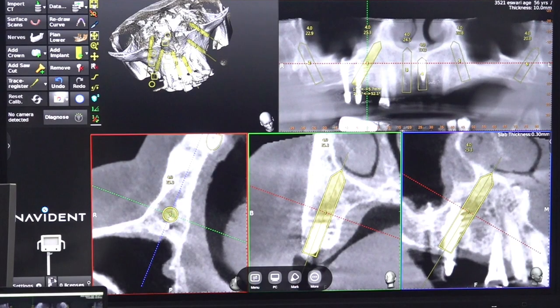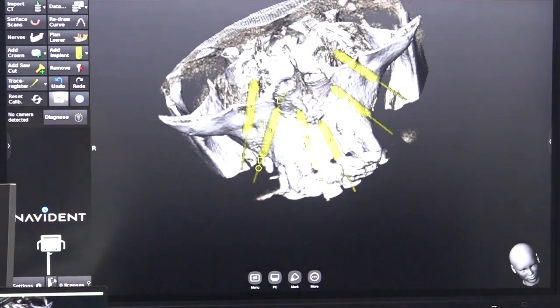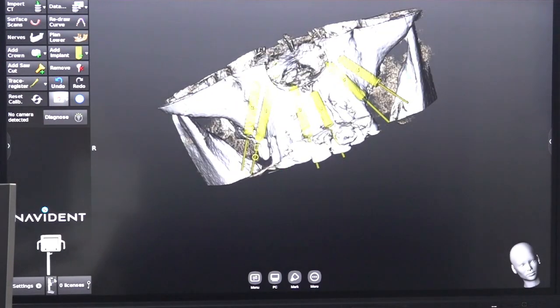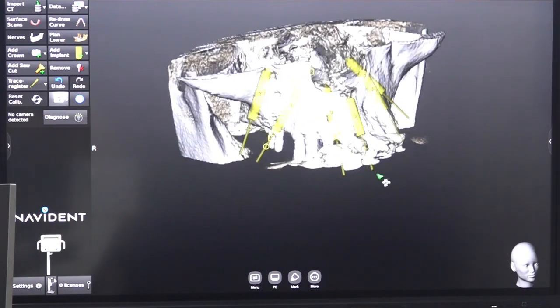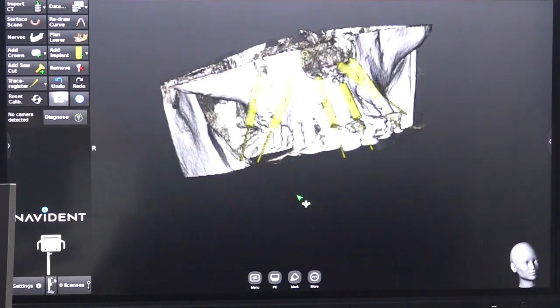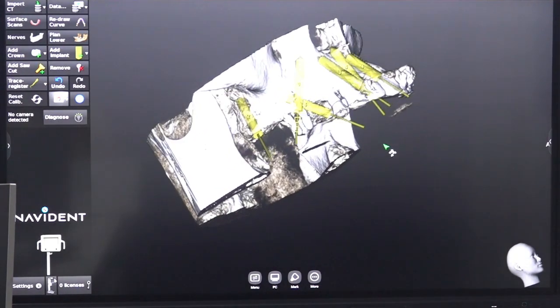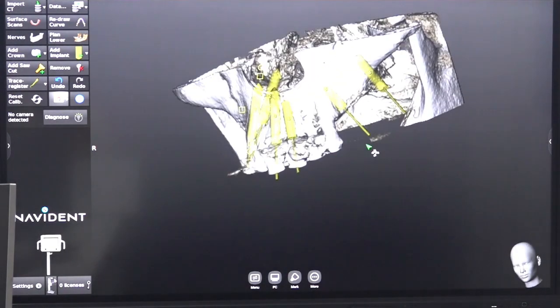We are going to do the virtual implant planning today. So before doing the planning, we will see the 3D reformatted image view. Already we placed implants, 6 implants. The patient has 2 single piece implants on the right side. Patient is a heavy chewer, so that is why we are planning for pterygoid also. Otherwise, we can treat this patient by all-on-4 also.